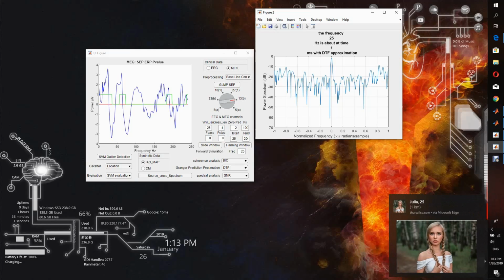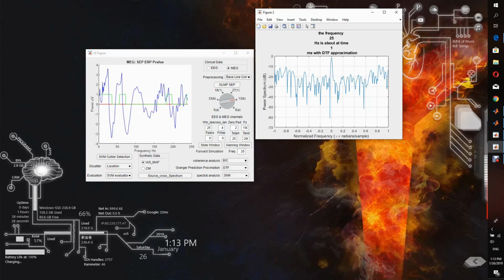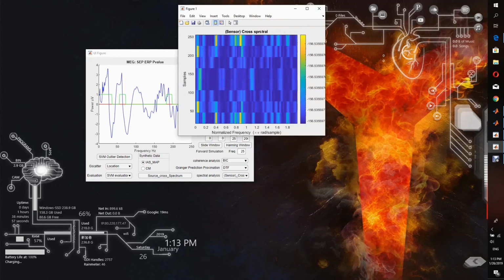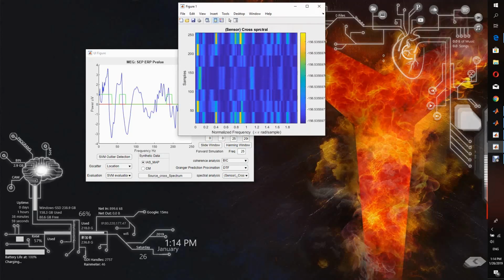From here you can see the coherence completely, but the information is sometimes bi-directional. Of course, as you can also see here, it might not be strictly symmetric.